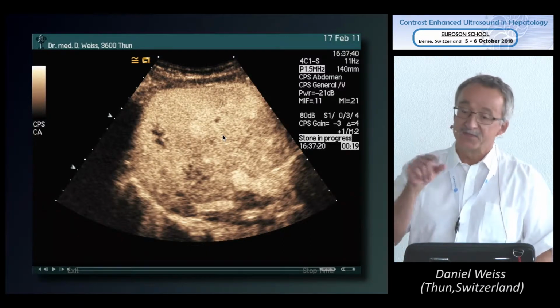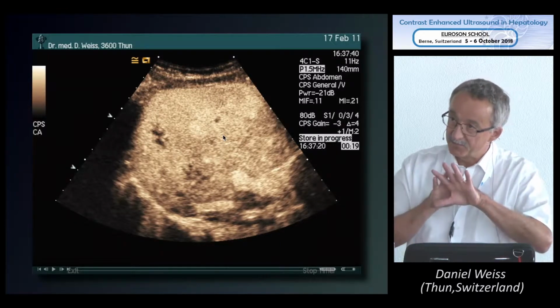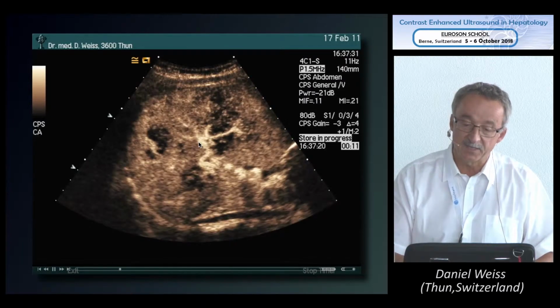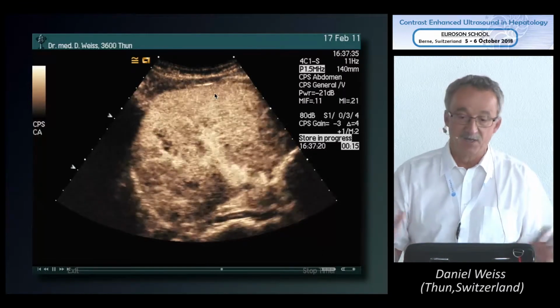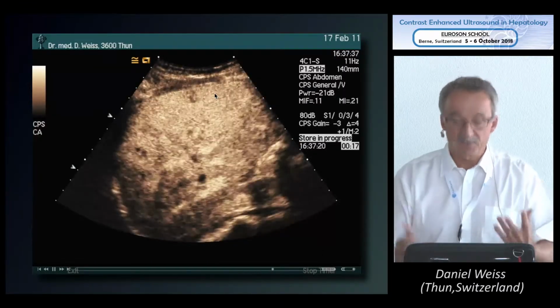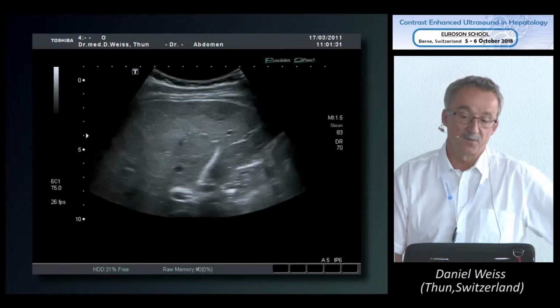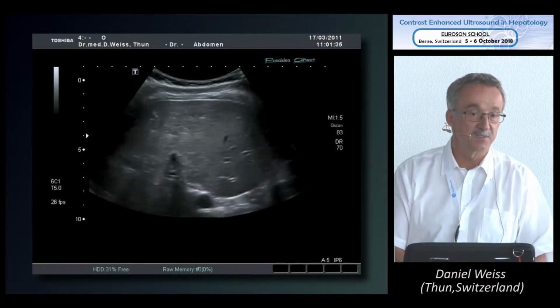That's something else. So this is not a desmoplastic tumor with some preserved vessels. This is normal liver tissue. Look at what happens. This is normal liver tissue with a preserved architecture. So this is inflammation. And this is the follow-up, 1 month later, 1 month after treatment.